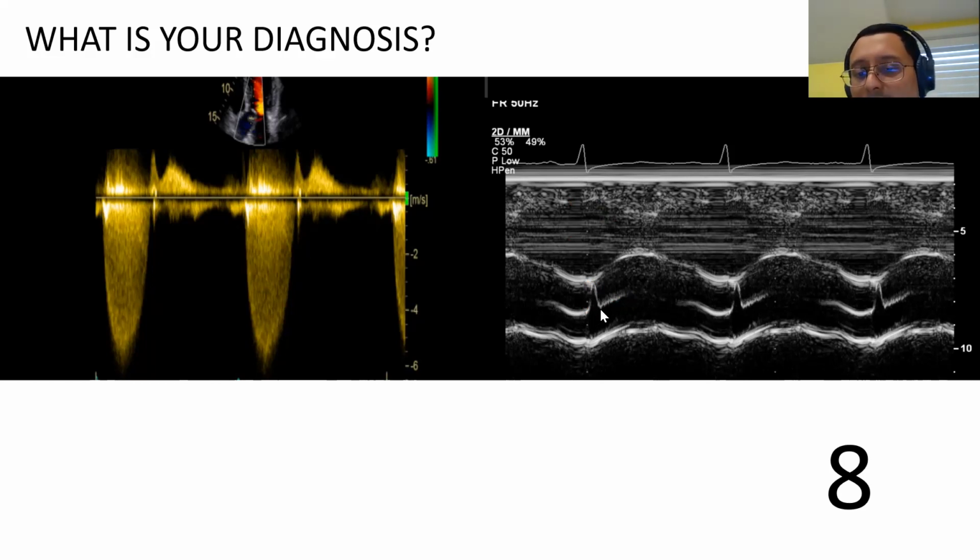Number three, remember I told you, look at the fluttering of the anterior aortic valve leaflet. Remember, a calcified leaflet cannot move, so how can it be fluttering? The only way it flutters is if it's thin. Therefore, the obstruction is below the level of the aortic valve leaflet. So this is a subaortic stenosis. All right, remember this.